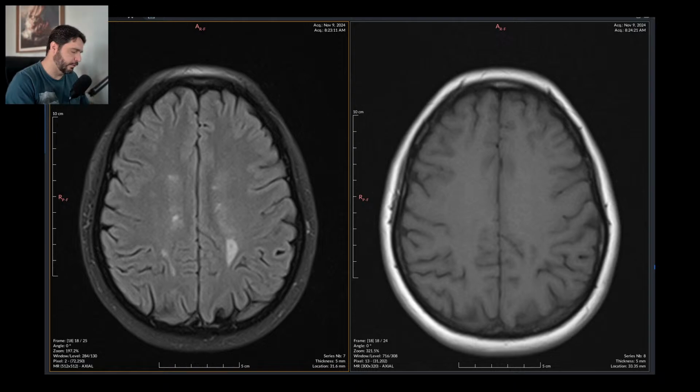Just do a follow-up. I always write down a footnote about the follow-up findings. This is a negative follow-up because there is no change. So I just say that the current exam is unaltered. It's the same.